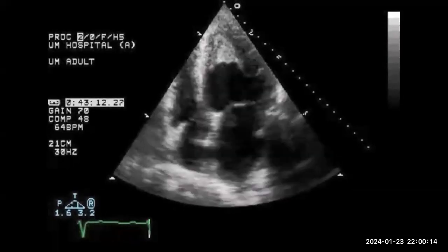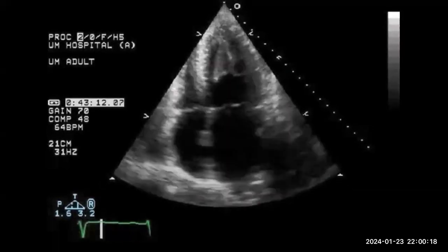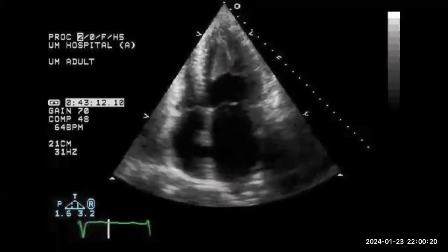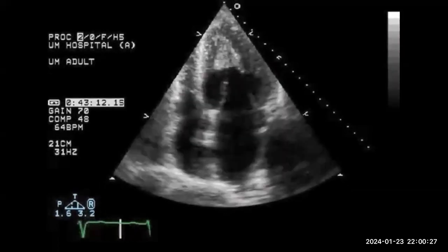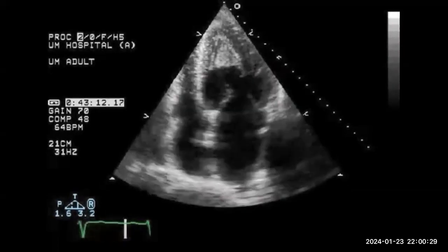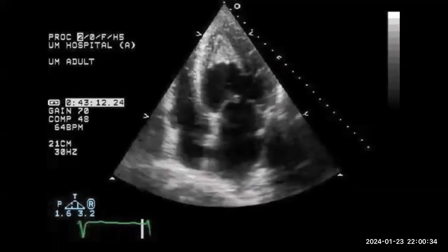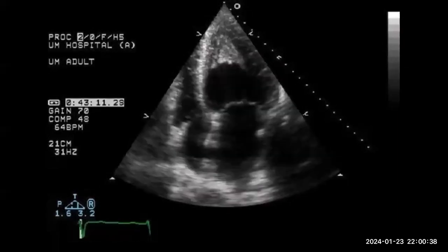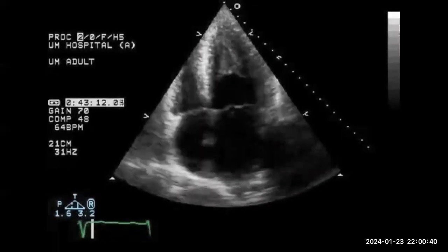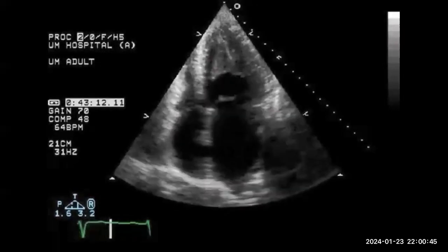So Fahd, if you want to put it in the coding, what will you put? You have the systemic disease, hypereosinophilia, endomyocardial fibrosis. This is one. For the LV, you can comment and put LV mass. Okay? And after that, you can choose any other. Of course, if you put apical HOCM, I will pass it as a correct answer, because as I told you, without contrast you cannot differentiate between them.